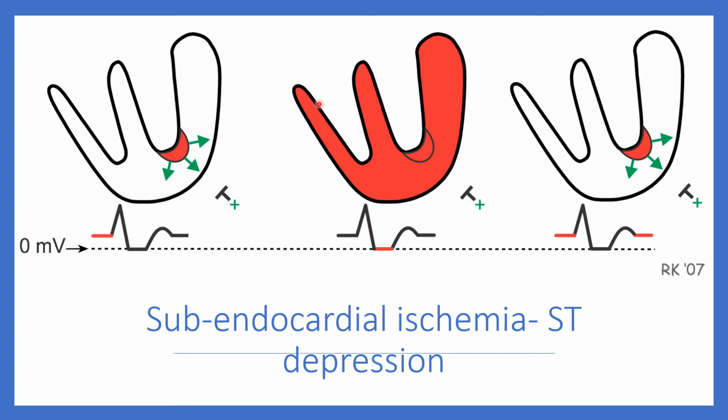So then the rest of the myocardium, when it gets depolarized, you have a QRS complex that happens for a moment. The ST segment comes down to the baseline and then the T wave is formed. And then after the rest of the myocardium is repolarized, remember this part of the myocardium always remains depolarized. So therefore the ECG returns to this baseline depolarized state in this electrode, and therefore your PR segment is still going to be elevated.